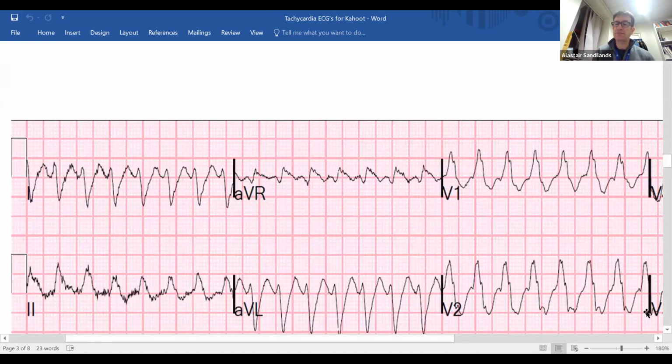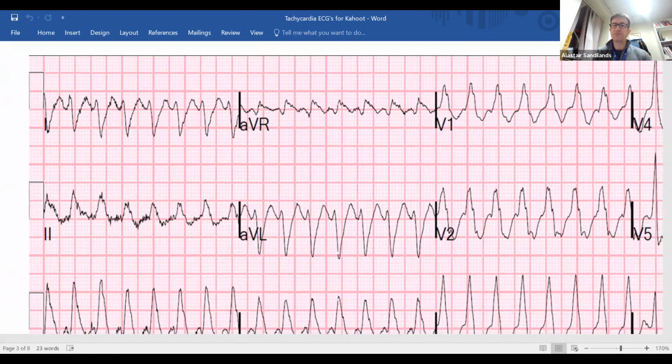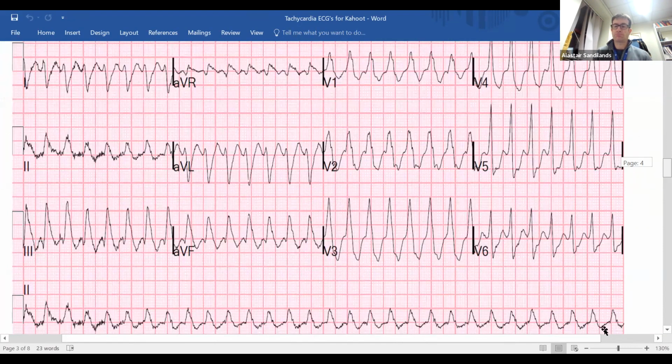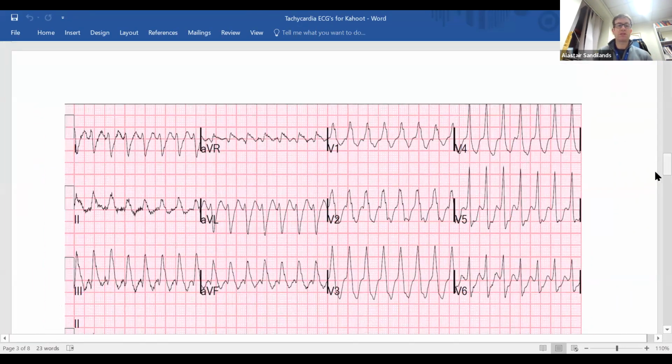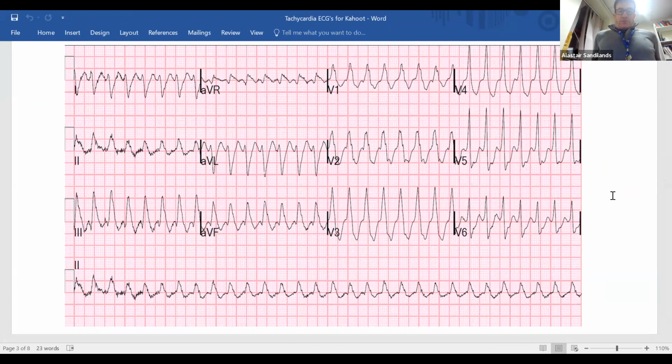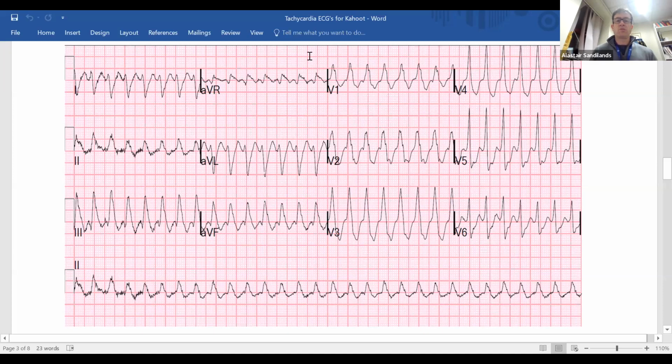Okay, and so this is the last one. A little bit of a curveball. Let me just make it smaller. Let's just see, in preparation for next week, how you do on this one. So these are the last questions, 27 to 32. Okay, last questions now.